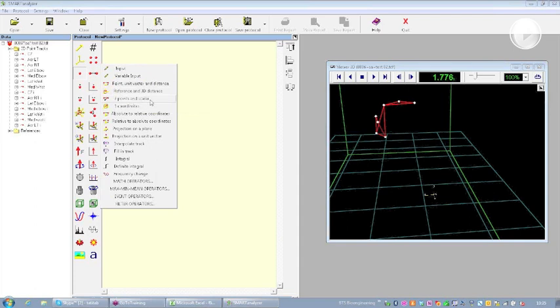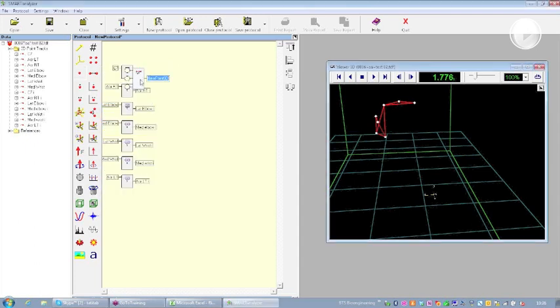The scalar is going to be the numeric value that I need to define on my own to create something that is going to fall inside the middle of this distance. So I click over this track. You can see that in this case I have 3 inputs and 1 output, that is always going to be a 3D point.